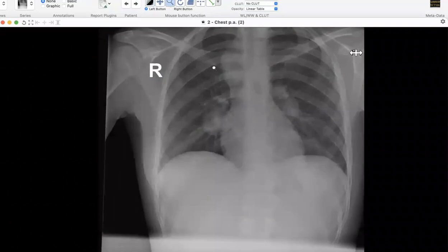The patient was 14 years old. This is a follow-up X-ray, and over here you have quite clearly the paratracheal widening as well as bilateral hilar nodular masses. And then, in fact, even on the X-ray, you can comment that there's hepatosplenomegaly. Okay, when you're saying lymphoma, always try to comment on the spleen as well.